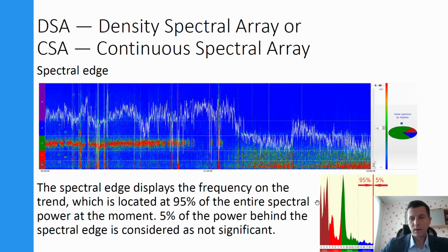It means that much more power of the spectrum goes to slow activity, and it is also clearly seen here. Here we can see alpha band activity, and now on the right side it is delta rhythm activity.